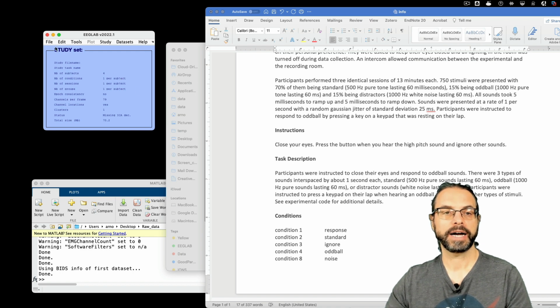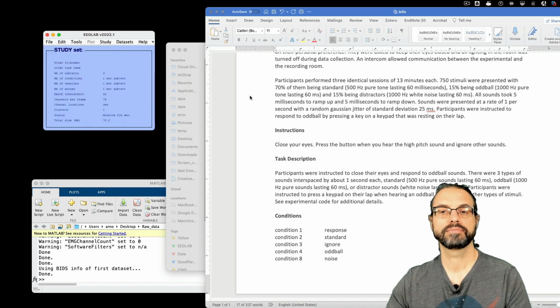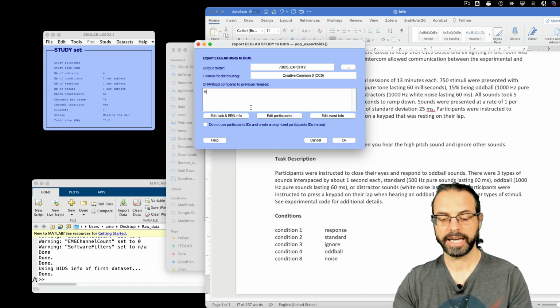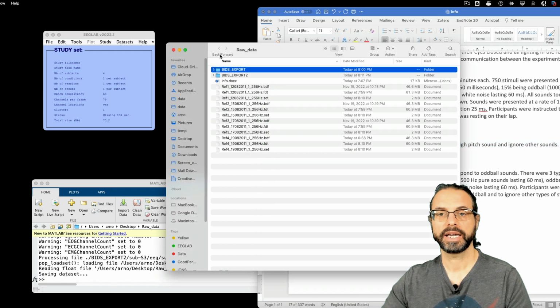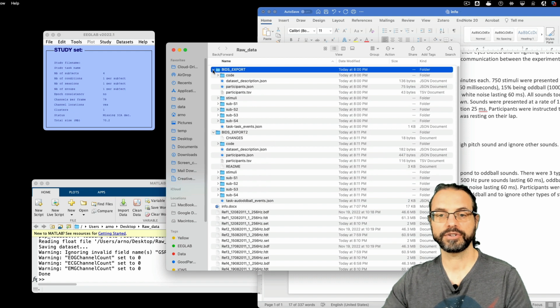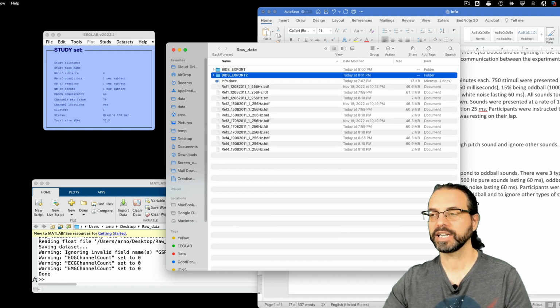And now I'm ready to export the BIDS dataset for a second time. So I'm going to call it export 2. I'm going to leave everything default here. Changes, I can say the changes. I added the metadata compared to version 1. And then I'm going to press OK. You want to resave the subjects? Yes. And now we have BIDS export 2. That looks like the first one, but we have the README file and we have much more metadata now in the second one.